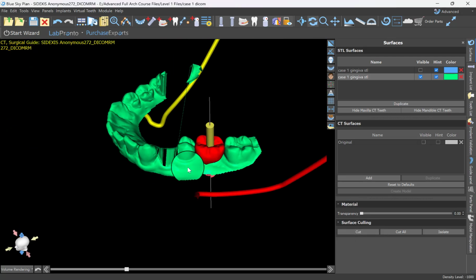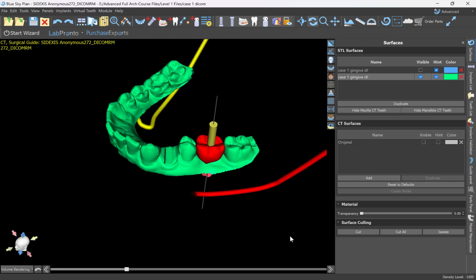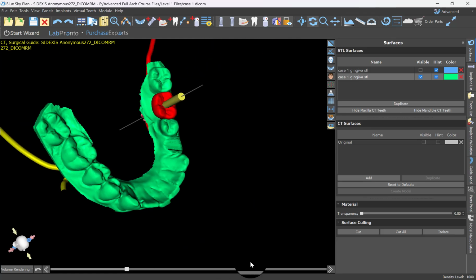That cut tool cuts indefinitely, through space. So anything that's behind the area that you're cutting on is also going to be cut. Well, I don't want to do that. So I could either click this back arrow and undo it, or just Control Z on your keyboard and that will undo that. All right. So that would probably work right there.